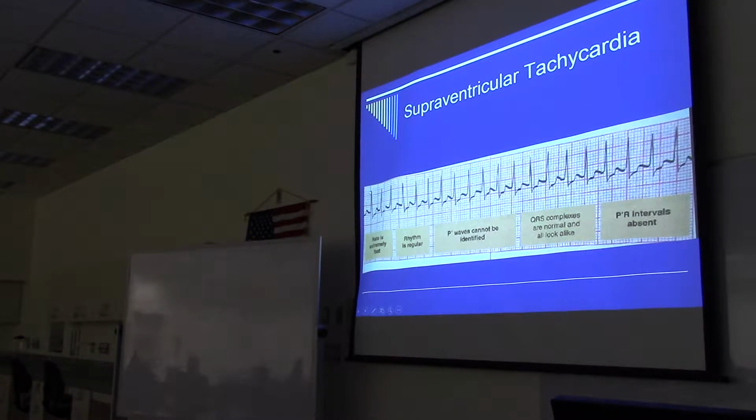If there's one here, skip a line, and then there's another one here, we know the rate is 150 per minute. So 300, 150, 100. So this is between 150 and 300. What's in the middle? 75, so about 225. So this rate is about 225 per minute.